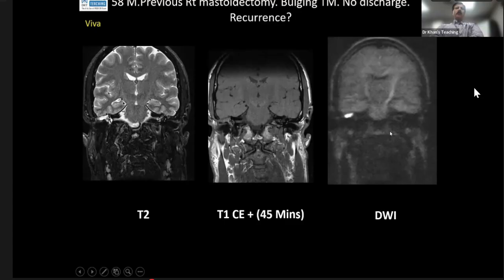They will do a partial mastoidectomy or even more extensive types of mastoidectomies. So there will be just soft tissue visible on CT scan. Is there a recurrent cholesteatoma? And it was a nightmare. So people developed this protocol. In a post-op temporal bone, three types of things can be visible. One is granulation tissue. Second thing is fluid. And the third thing is recurrent cholesteatoma.